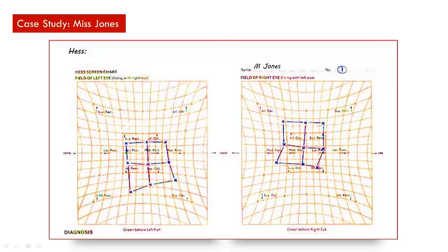If we look for secondary inhibition of the contralateral antagonist, we're really not seeing all that much here. And in terms of the ipsilateral antagonist, it's not particularly obvious that we have an overaction here. This is where it's important that we probably do that 30-degree outer field, because the over and under actions are relatively subtle and we're not picking them up very easily on this inner field.